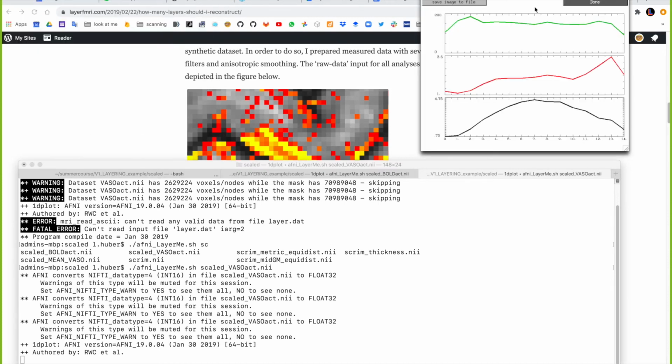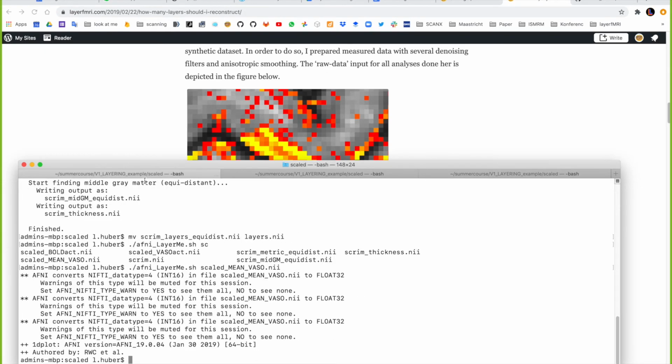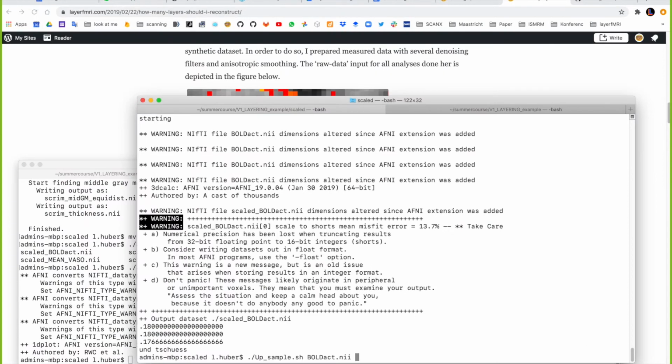That's a very good question. In fact, for the LN2 layers, it does not have any differentiation between 2D and 3D. So if you run this with a 3D data set, it does it just the same.